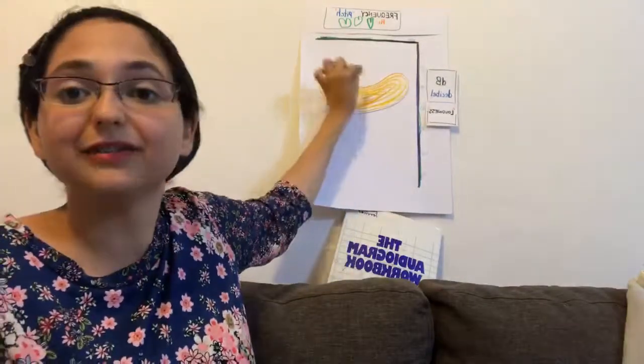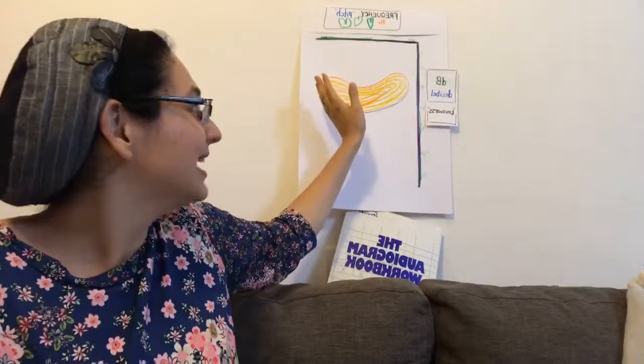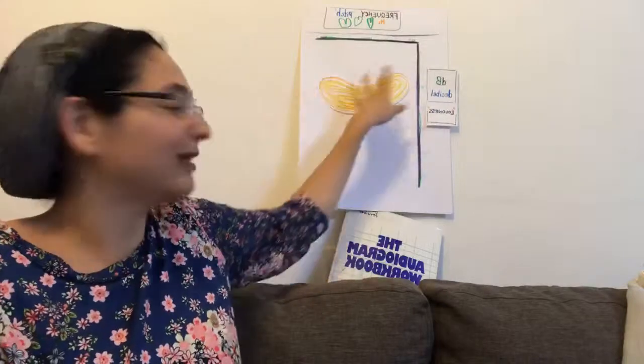And that's just why they call it the speech banana, because it's kind of this oval shape. And what it shows you is where the sounds of speech are. They'll put all the different letters in the speech banana, higher frequency consonants in the higher frequency section, and the vowels over here, and then the other letters sprawled out around it.